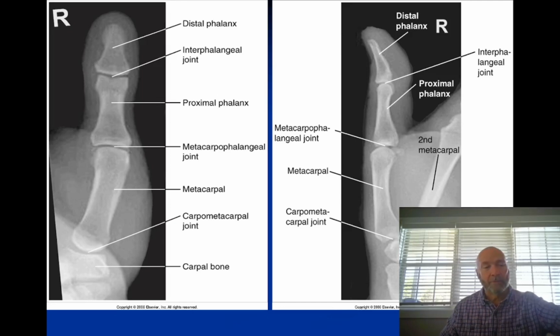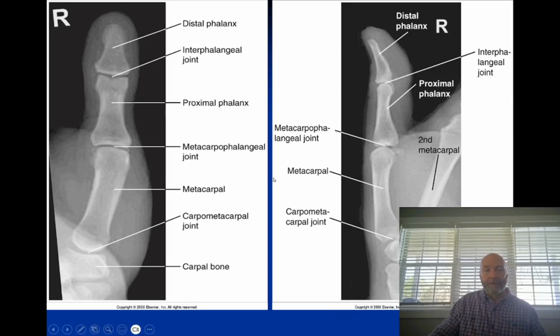You're going to have two problems. One is that if it reads that entire area of direct exposure radiation to the image receptor, your index number is going to come up and it's going to show that you overexposed the patient when you might have set the perfect technique and you did not overexpose the patient. And number two is that it's going to see that entire radiation field and think that your entire finger is the size of that radiation field, and it might shrink it down so that you get these little bitty images of your digits. Those are going to be specific to your equipment type. If your equipment doesn't minimize your image, then that's great, but be aware that it very well might.